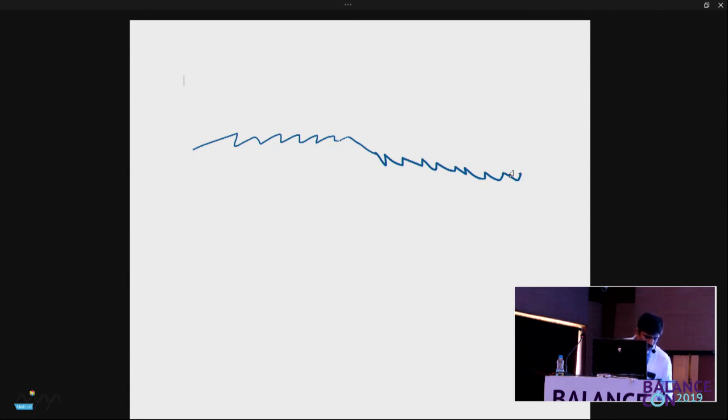Yes, at the 10th to 22nd, it was right beating. Then it became left beating. Then again, it became right beating. Super, wonderful. Okay, that's nice. Super.